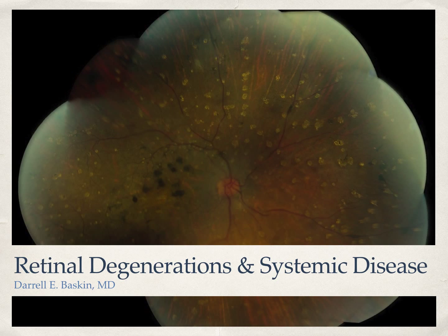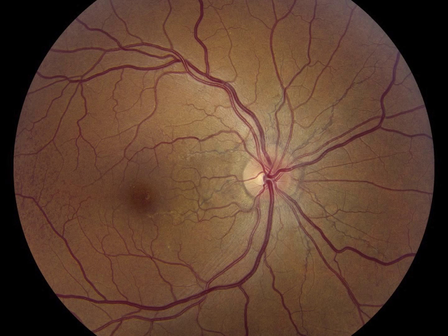Okay, retinal degenerations part 2. Good. All right, what I want you to do is describe what you're seeing. So, fundus photo of the right eye. Good.